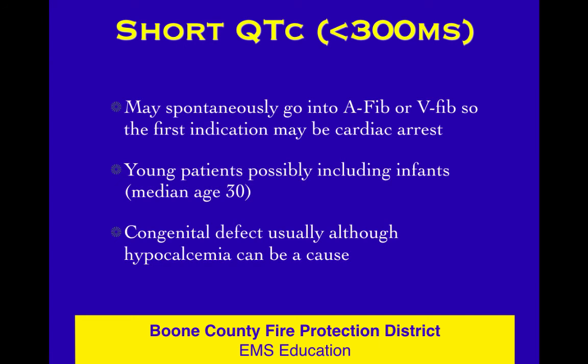Remember, PRI is between 120 and 200. QRS should be less than 120. QTC should be between 300 and say 500 to make things nice and easy. Technically, maybe more than 450. And so those are the numbers to remember, and it tells you that there's a problem in the conduction system. The reason we're doing measurements early on in RPM, early on in our analysis, we're looking at rate, we're looking at what are the atria doing, and then we're looking at what's going on in the conduction system. And the measurements allow us to assess for problems in the conduction system. So that's the measurements unit.